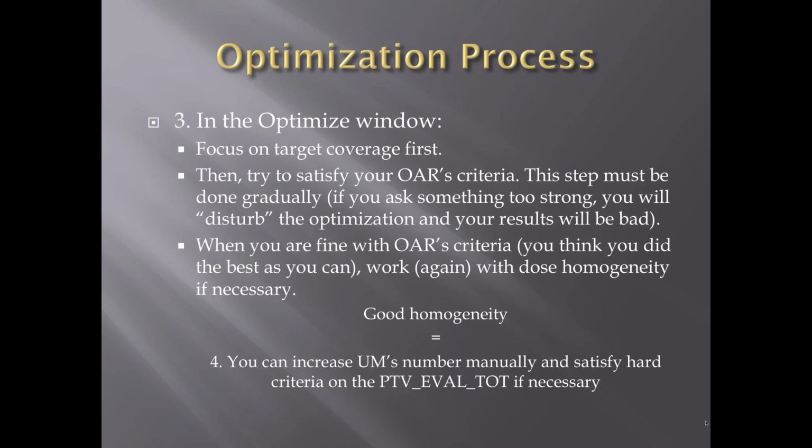This step must be done gradually and not too fast, because if you ask something too strong, you will disturb the optimization and your result will be bad. So don't ask something very hard to obtain, because you won't have a good dosimetry, you will lose your base, and you will have to start your optimization again from zero.